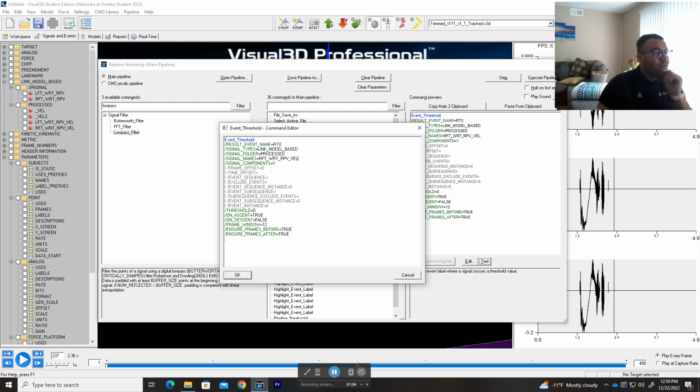All right, so then we choose the component of y because we want the sagittal plane, since that's the walking direction. If you're doing lateral stepping, then you use the x, you know. It depends on what data you're using. If you're using gait, then make sure you use the right coordinates. And then here we set a threshold of 0, because, again, like I mentioned, it's the toe off.